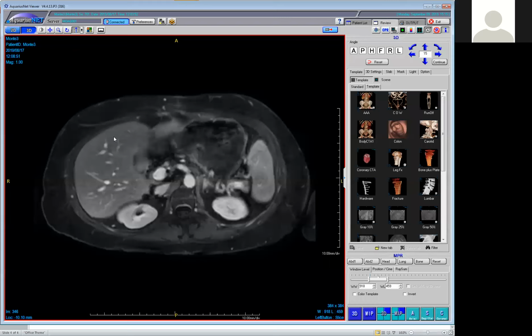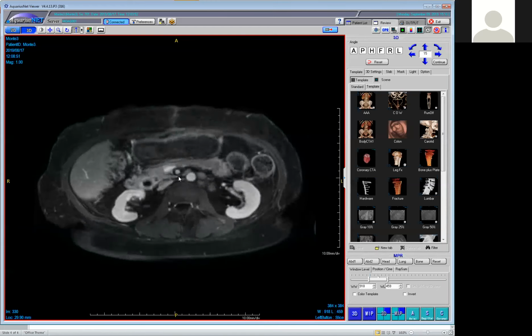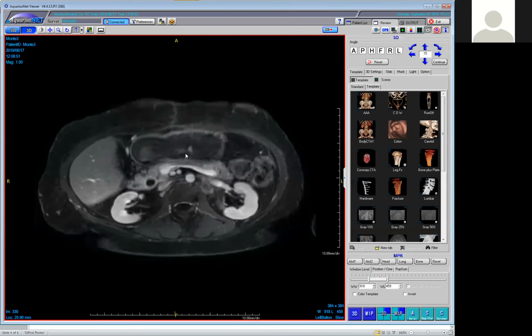So I think the patient is asymptomatic in the sense that there's no abdominal pain, but the degree of compression was enough to compromise inflow into the hepatic artery, and because of that, she developed a bunch of biliary strictures, and she's going for revision of the arterial inflow this week, I think. And here's the aneurysm that I missed.